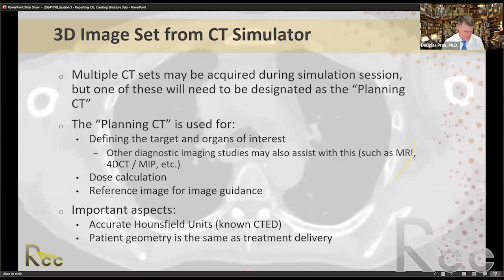The other scans you might collect can aid in target delineation. For example, I would recommend you get a separate scan before you put contrast in. So you would have two scans, one without the contrast and one with, so that you don't have to override all the densities of the contrast in the patient. This would save you a large amount of time.